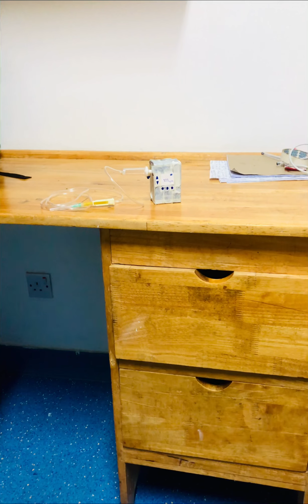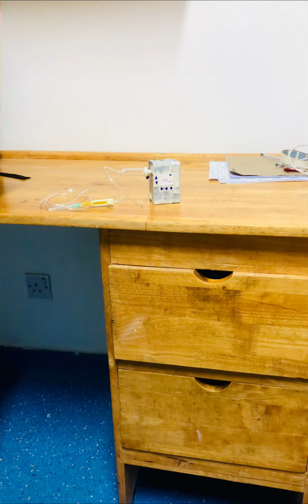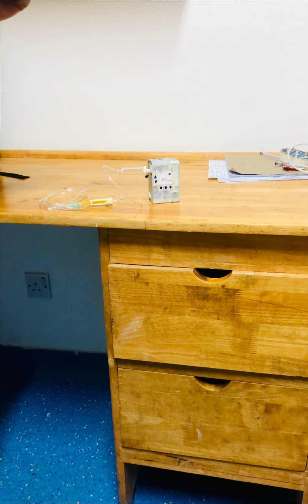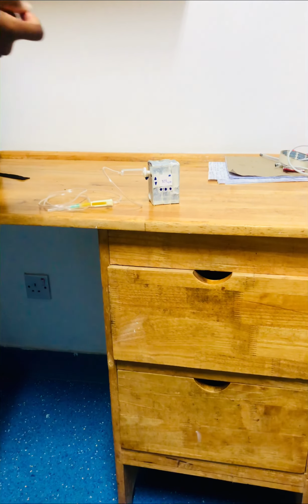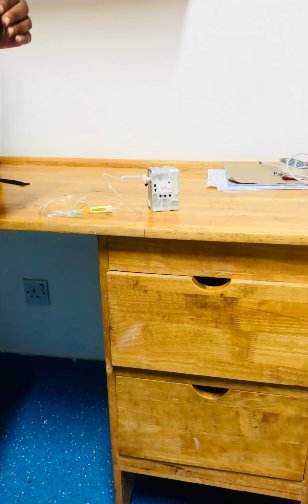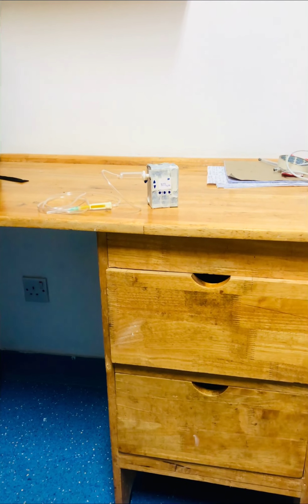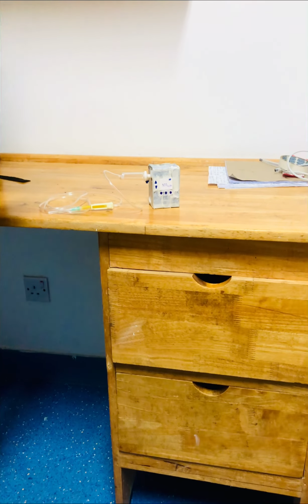That means if the amount of glucose in the body is high, the motor will step a large distance, that means a lot of centimeters, which is going to be a large volume of insulin delivered to the body. And if the amount of glucose is low, the insulin that is going to be delivered is also low, depending on the distance that the stepper motor has pushed on the syringe.